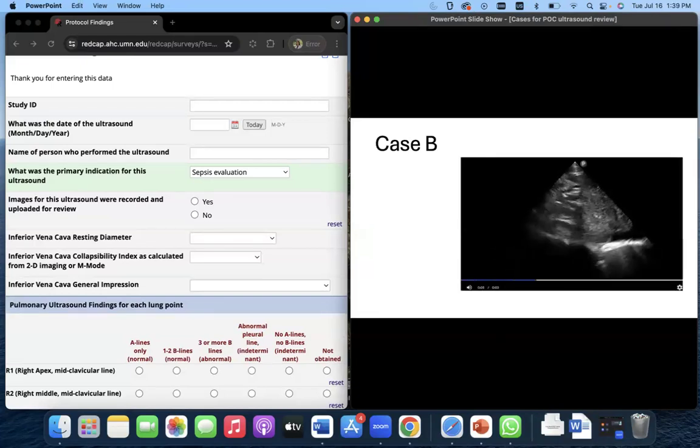Yeah, and I think that's an important point that Eesha brings up, that sometimes you're doing this quickly, and from an academic standpoint, it's good to do measurements so you know exactly what you're looking at. But sometimes just looking at it visually, we can see here that there is an IVC. There's a little bit of shadowing, but it looks to me like towards the end of that video clip, the IVC collapses completely with the respiration.